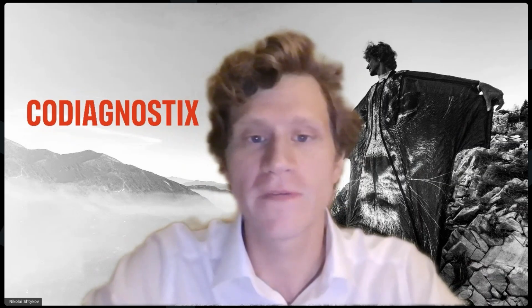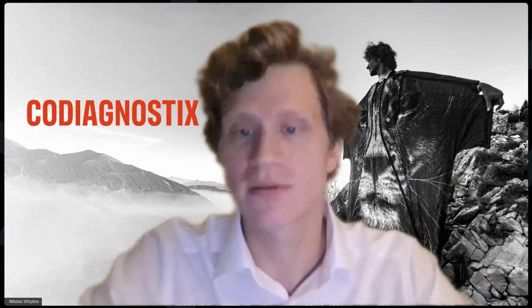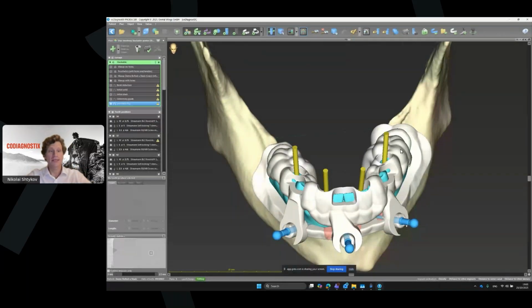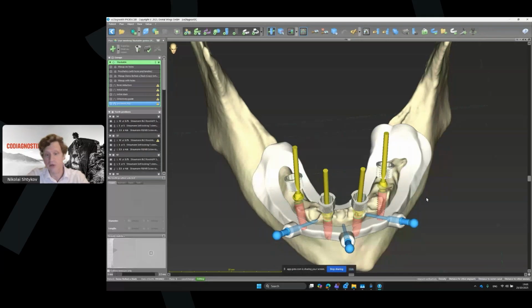That's really good that we finalize it a little bit faster. Okay, let's start with the pins, and then we will go into the prosthetics.